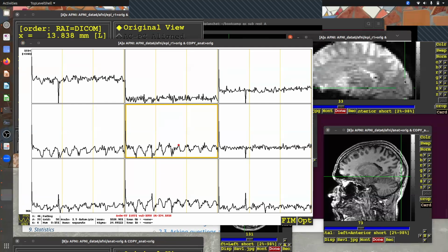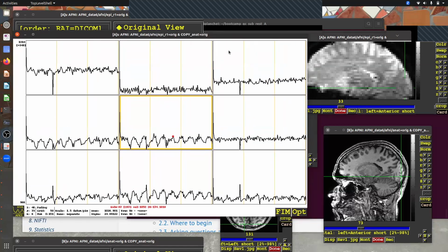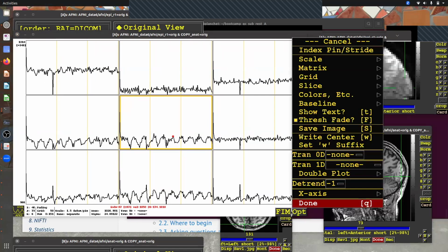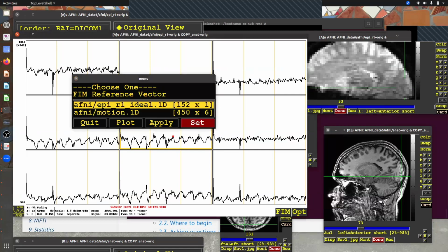And that's why I knew when I click back here that some parts of the brain might look something like that. So I can also turn on here and show you a little bit about what the actual paradigm looked like, just to prove a little more about this. I actually have stored in this file an idealized time course based on the on-off pattern that the subject did.